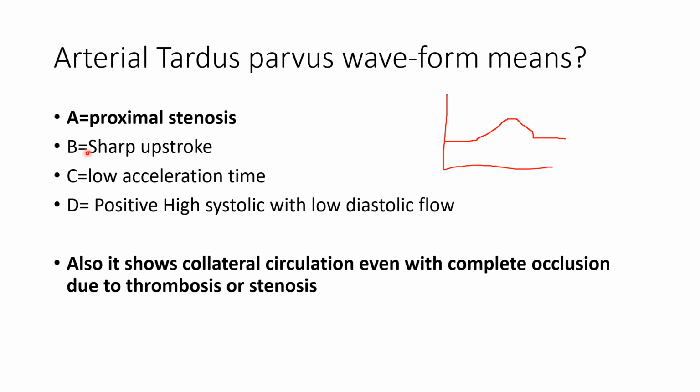What we can have after stenosis is this tardus parvus waveform. Low acceleration time is normal, but here we have a very long time to accelerate from here to here, to reach the peak point. And systolic is not high, with low diastolic flow.